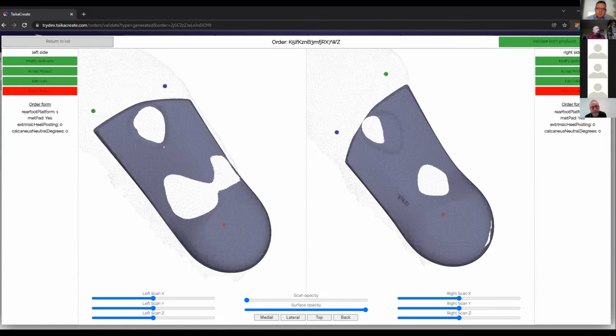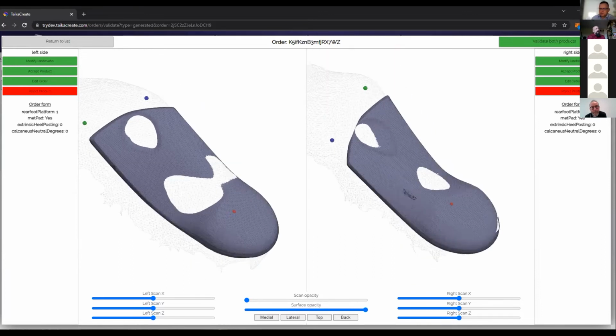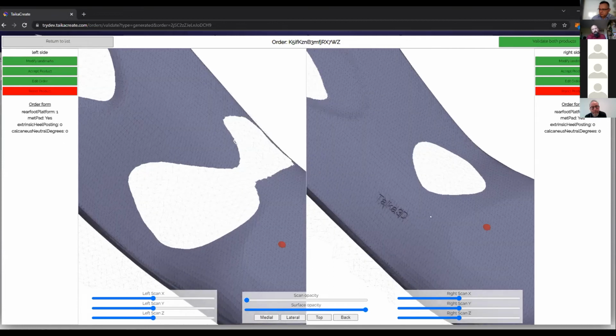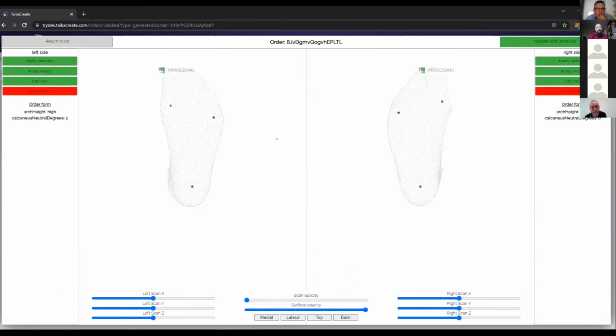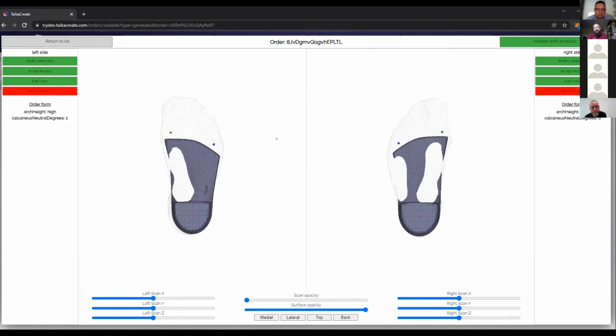You can just see all these various features, and I think in Axel's presentation we saw some really good examples of what can be achieved in terms of the design and these complex and nice looking geometries. We have also done something similar, maybe not quite as impressive as that. But these are usually functional components, and you don't really have a lot of space to play with inside a shoe.